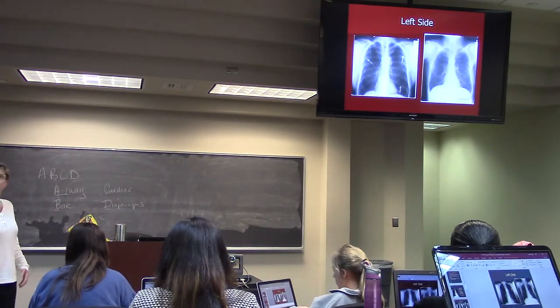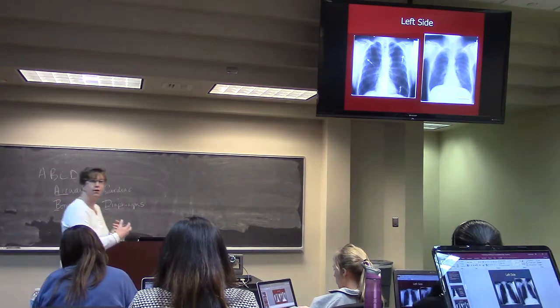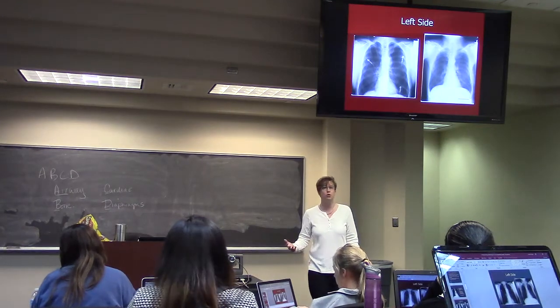If I'm standing like this, it may make my heart look like it's shifted. Or it may make my trachea look like it's shifted. So I might say there's something wrong, and there's not. I need to have them go shoot a different x-ray.